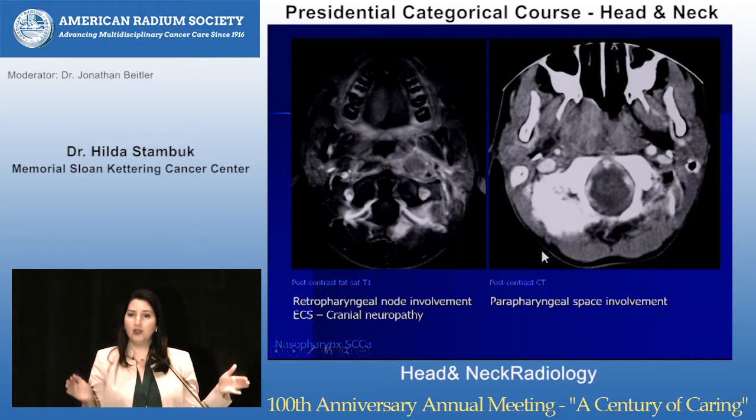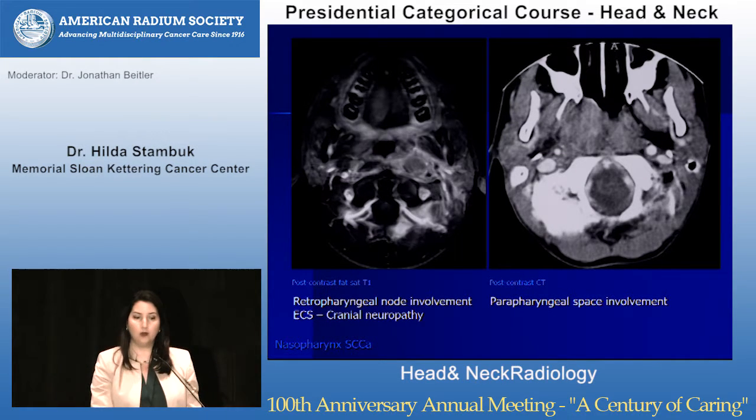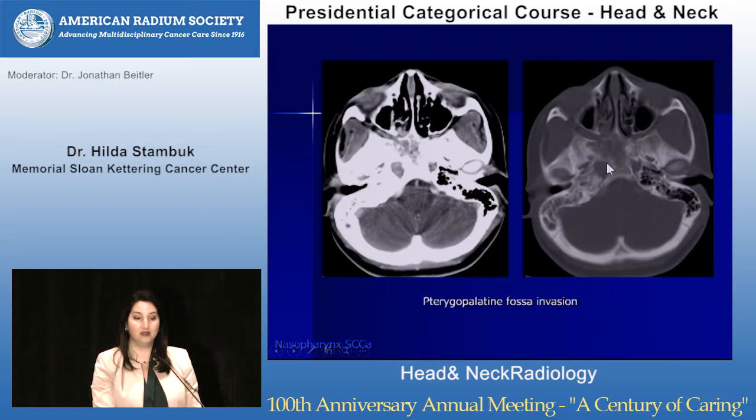Now, I told you the pharyngobasilar fascia stops the tumor from going laterally, but it eventually does break down. You can see this big nasopharyngeal tumor. Look at the parapharyngeal fat on the opposite side on this CT. It's nice and black. If you look on the right side, you can see these finger-like projections in it. So you don't have to have a ball going into the parapharyngeal fat. That's just tumor, like little fingers going into the parapharyngeal fat, and that's gone beyond the pharyngobasilar fascia.